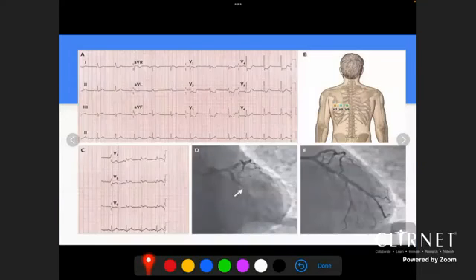Here you can see there is no ST elevation. We said 1, aVL, no elevation, 2, 3, aVF, no elevation. Here also from V1 to V6, no ST elevation. So this patient is having STEMI without ST elevation. Why? Because of the isolated posterior ST elevation. Here when they did ECG posterior leads, there is ST elevation in V7, V8, and V9 with very subtle degree, and you can find that the LCx is occluded completely.